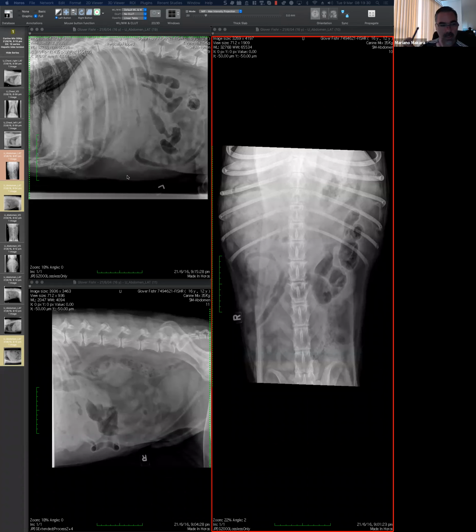And I think that is a game changer, even though it's a subtle change. It's an important point to put back in context with the dog being painful and depressed. Okay. Anything else that we want to describe? Anything else that you want to add?